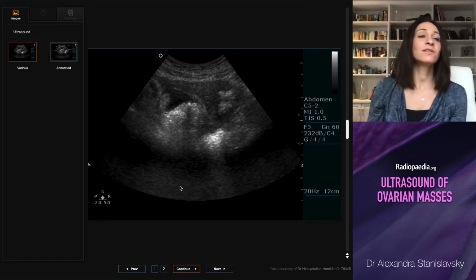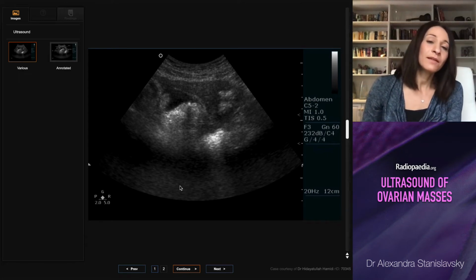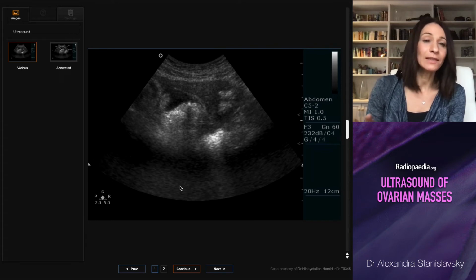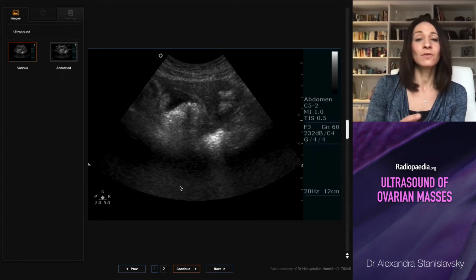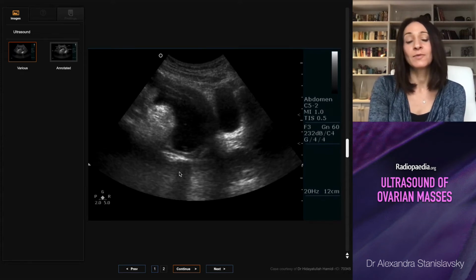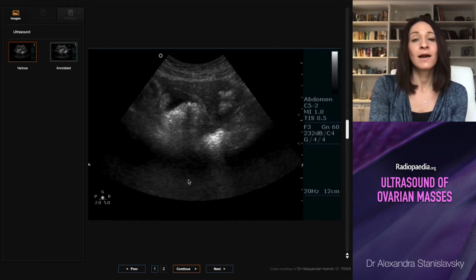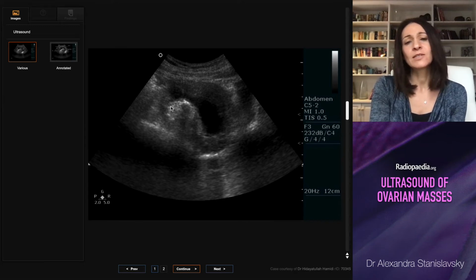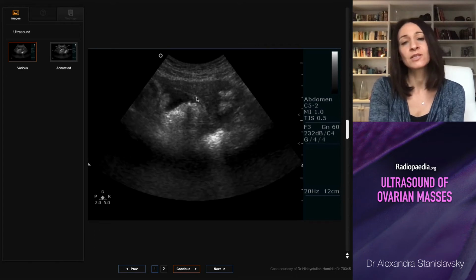But just to make the point that, as I said, that was an excellent example of a very beautifully presented dermoid cyst, and that is not always the case. So sometimes it's really hard to work out what's going on. That's just the reality of things. So if you look at the ultrasound images on this case, I'm looking at something cystic here. I think it's the bladder over here, but it's very hard to see. Is this part of a tumour that is shadowing, or is this bowel adjacent to some fluid?